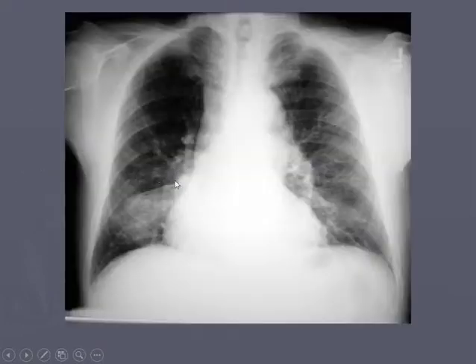Here's an example of atelectasis. So again, this right here is the horizontal fissure. Remember, in our previous X-ray, it was across right over here. And with that atelectasis, that squeezing of the lung tissue where it's collapsed, you can see that it's pushed downward, and we see this hazy density over there.